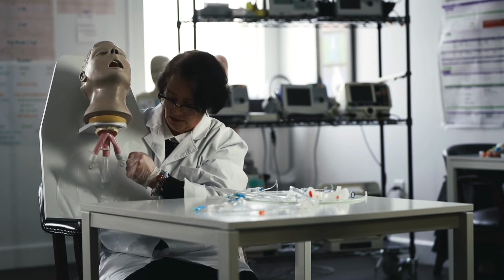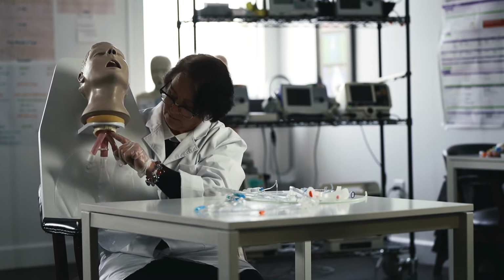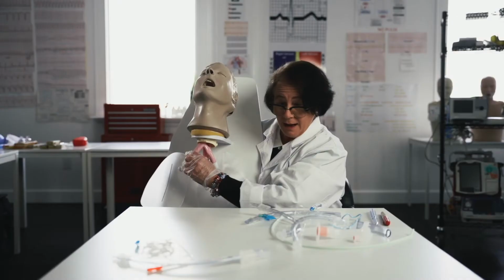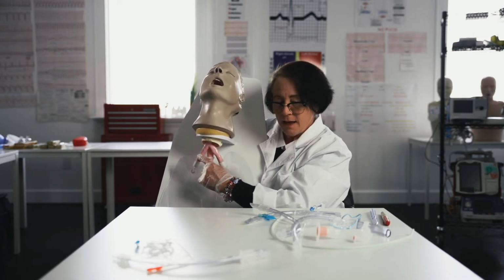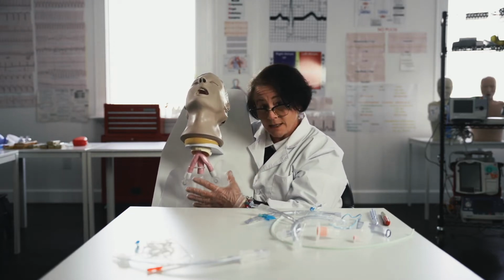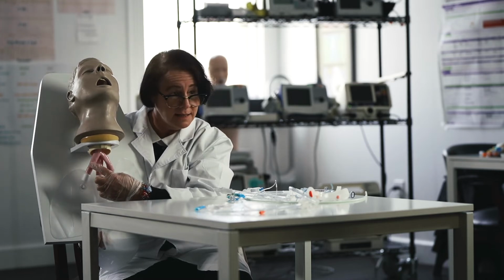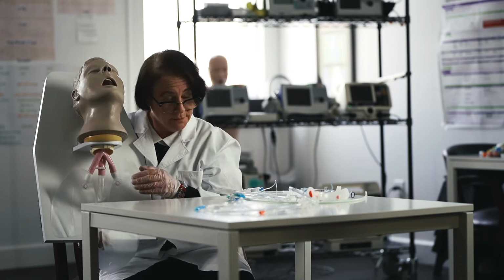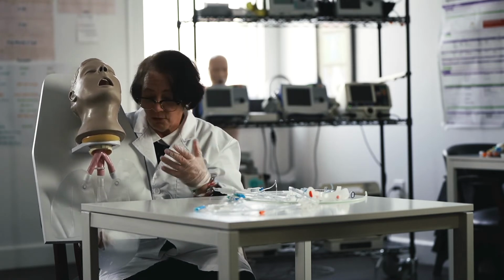Since there's only 2 lobes on the left, the left main stem bronchi is not very parallel or very wide, whereas on the right, where it's going into 3 lobes of that lung, it is rather parallel and rather wide. So you can see how if the tube is sitting here, it will always favor the right main stem bronchi. Now, there are many ways to know your endotracheal tube's in the right spot. One way is, once the tube is in, you should have bilateral breath sounds, bilateral chest rise. Your O2 sat should quickly climb to 100%. If it goes in too far, it will most likely slide down over here. So then when you give them breaths with the bag valve mask, this lung will go up and down, and this lung won't. If you're only inflating 1 lung, your bag valve mask is built for 2 lungs, so it'll be very resistant, and your O2 sat will be crummy.